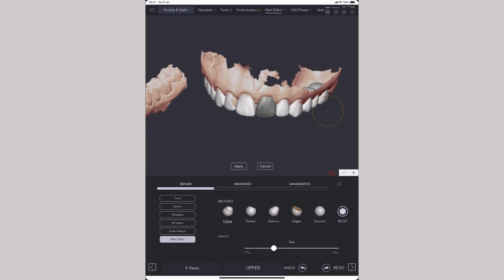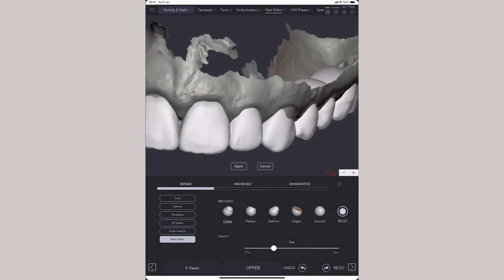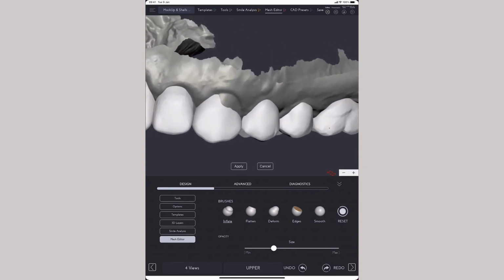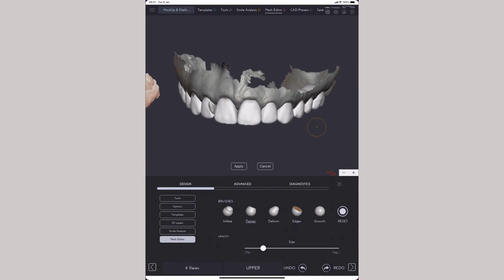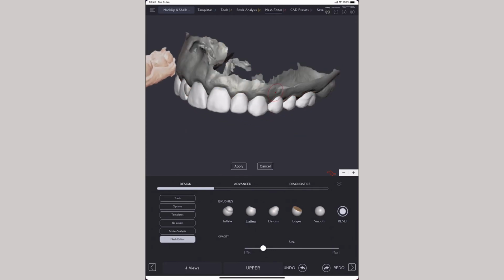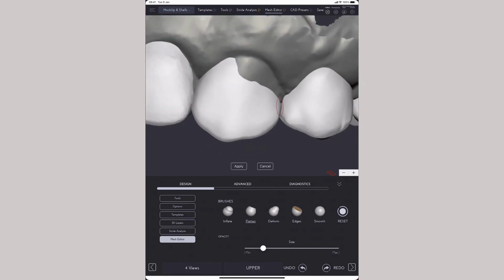The same happens if I do it for the STL file. The color changes, and so at this stage you can either flatten here, take off parts of the STL maxilla, so do like a virtual preparation, or just focus on the tooth template. If you do some modification on the STL maxilla by accident, just undo, reset that part, that area where you changed it.